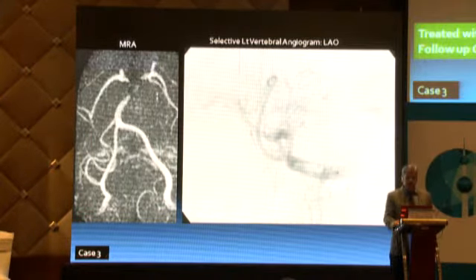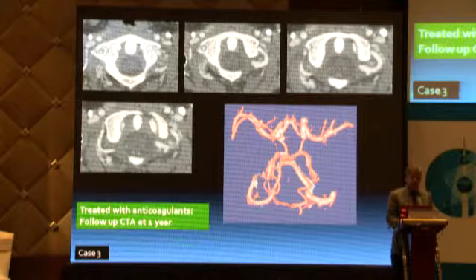Okay. So you can see that what happened over time with follow-up is this developed a pseudoaneurysm, and this is the C1 odontoid. This is C2, and you can see the vertebral artery swings in over here and goes into the dura, right? And this is a pseudoaneurysm which has formed as a follow-up to this patient. This patient actually did very well, and I think we followed her up for 8 years till she was lost to follow-up and went on to some other service.